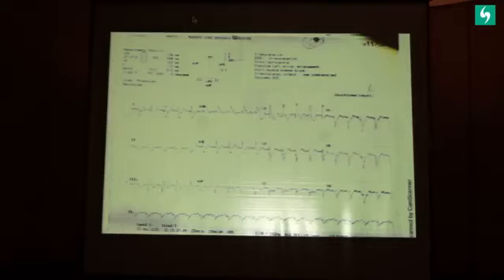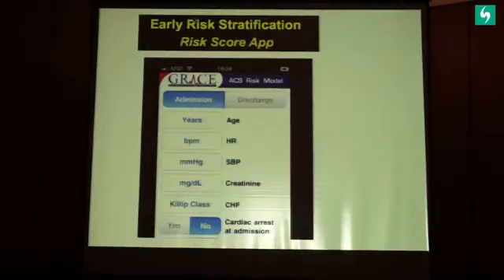And this is the troponin value which was obtained 2 hours later to be 18.6, and look at this range, so it is far, far higher, clearly telling you that this patient needs urgent attention. Now, we have got the ECG, we have got the troponin value. So how do we decide? His creatinine is 2.3 and now he's looking better, but how do we decide whether we should take this patient to the lab or we should not take this patient to the lab?